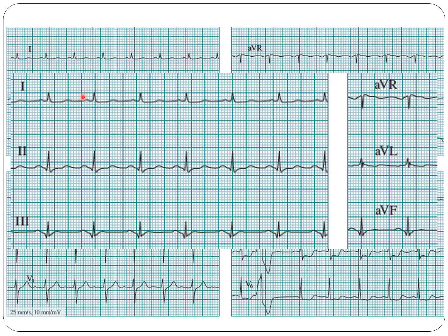Another possibility, if you want, you can count the R's in a certain interval. This is 1 second, 2 seconds, 3 seconds, 4 seconds. If we count for 4 seconds, we have to multiply by 15 how many R we are counting in 4 seconds. 1, 2, 3, 4, 5, 6. 6 times 15 means 90.